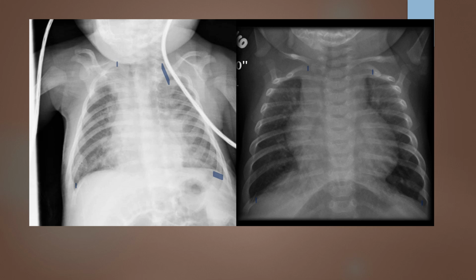So over here, I absolutely see cortical outline. I see bony trabecular pattern. Soft tissue detail, I feel like I'm missing it. Over here though, I don't have penetration, but I do have a long grayscale. So what I kind of need is something in the middle of the two of these. I want something with a little longer grayscale over here, a little bit brighter, but over here I need something with more penetration and a little more intensity, or a little more dense. So I would adjust both of these techniques if they were not in the exposure index range, and if I wasn't able to really window level them to an area I wanted.